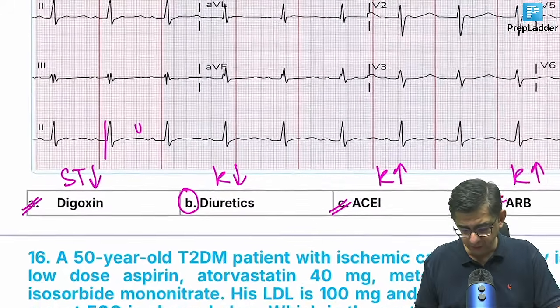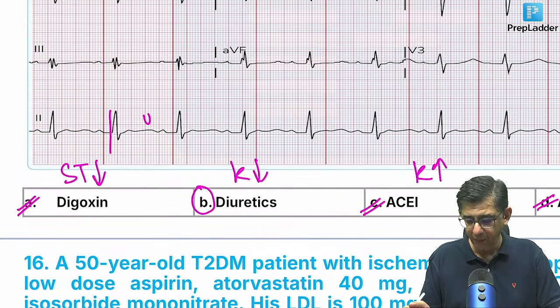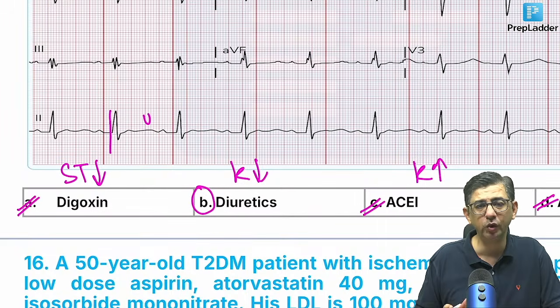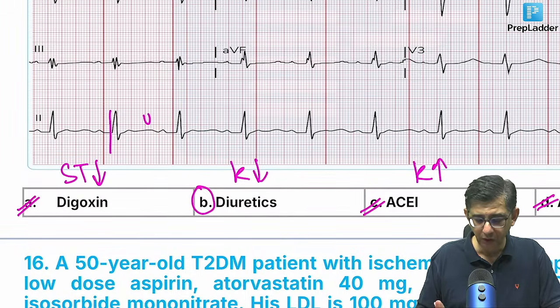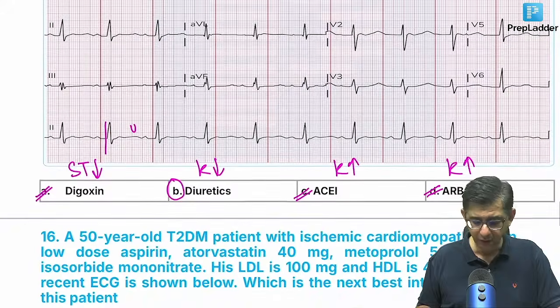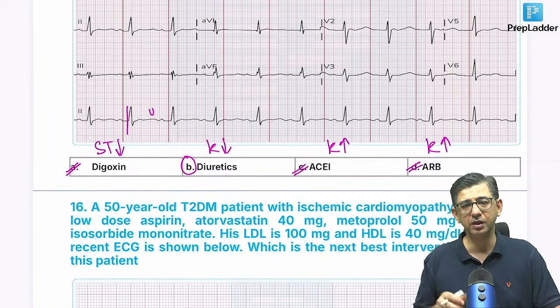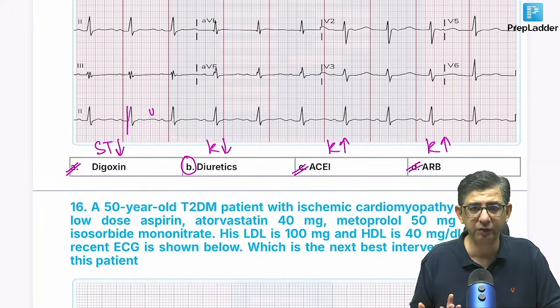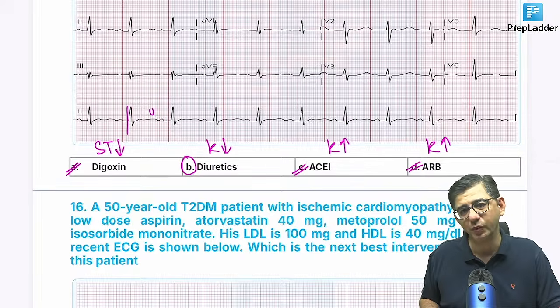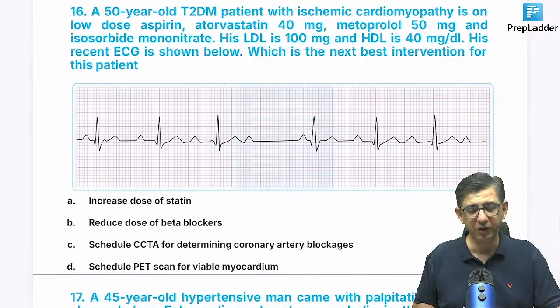No, doctor, I'm not saying that that would be a U wave. It should have been present here. It's not a very good deflection, I can say. But yeah, what I can say is that इसमें जो QT interval है, that is like a little normal QT interval था 9 to 11 small squares का. तो यहाँ पे जो QT है that would be like increased a little on the higher side of normal, but it's difficult to diagnose practically. सो मैं मानता हूँ तो ऑप्शंस के बेसिस पे हमें सॉल्व करना है यहाँ पे this one. So the 15th is, I would say, the least discrete finding that I have discussed before you, because अब सारे वाले तो ऑब्वियस नहीं होते हैं, तो some of them that I have to incorporate are like the ones where you will have to do a bit of exclusion capability, but practically not possible with the 15th one.